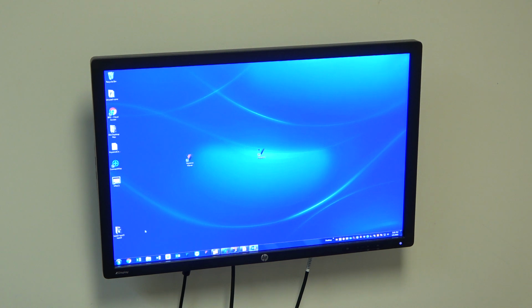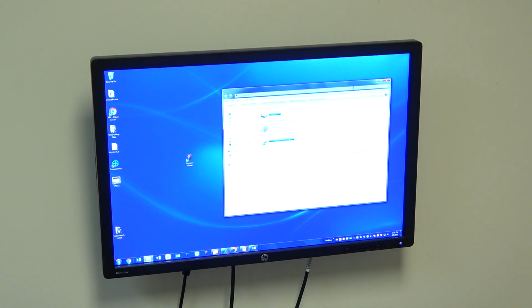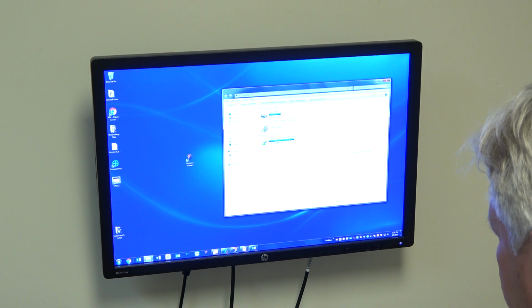We can take the same software that we are currently running, and they do need to be the same, the acquisition and the viewer software should be the same version. So we would go into our folders, and this one I don't have it configured exactly this way, but generally in our folders in here under the computer in the C drive is typically where we keep these.